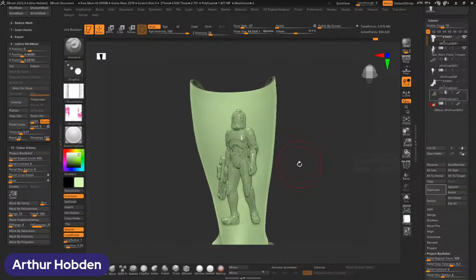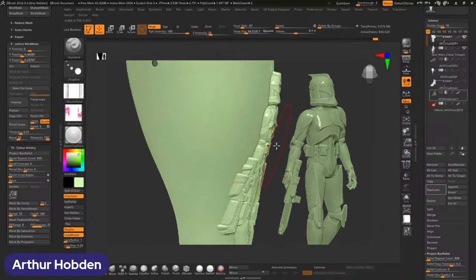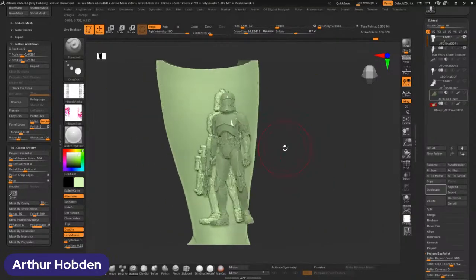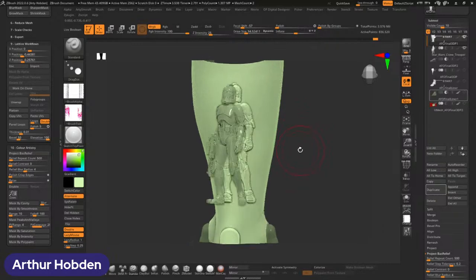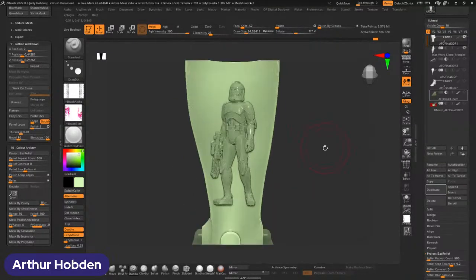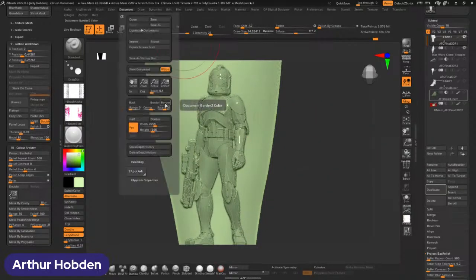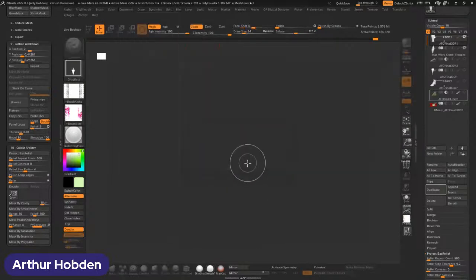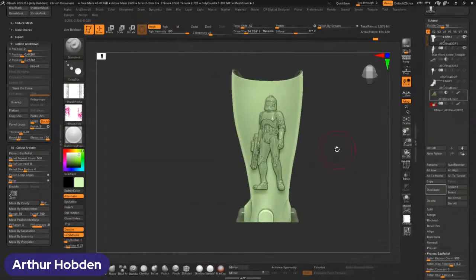Anyway, I'm going to refine this technique a bit more so that we get better results, but there you have it. It is possible to take any shape that you find online, and this can be some really high detail sculpt, and then you can project that as a relief onto any surface you want, and then go in and paint it. My goodness, my computer is trying to take off like an airplane right now. I think I'm overdoing it a bit, streaming and doing these crazy commands all at once.